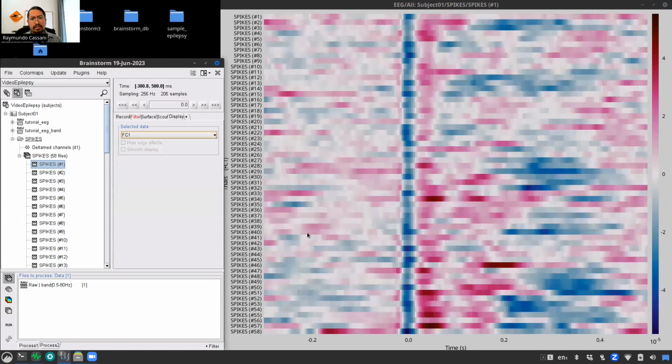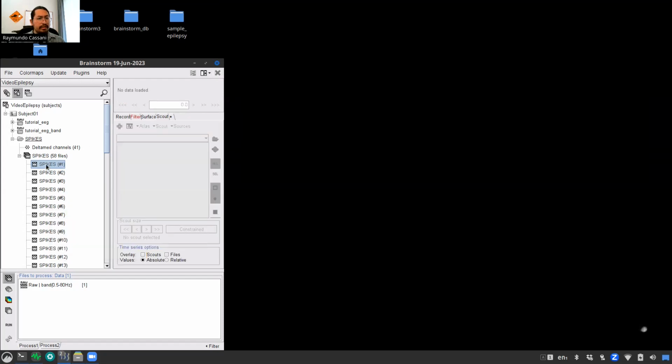And indeed, we clearly notice the spike in that electrode. So what we want to do now is to plot the time series for that electrode. So we close our figure, and we first open the figure for only one trial.